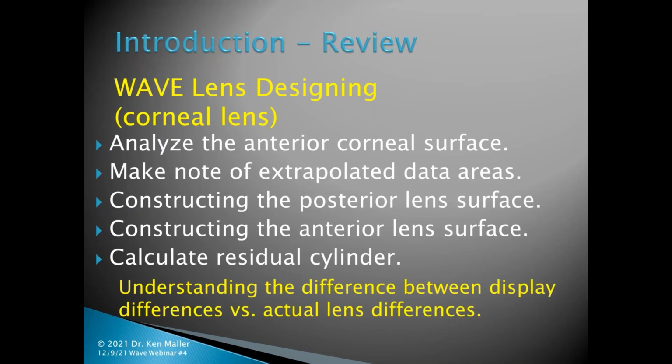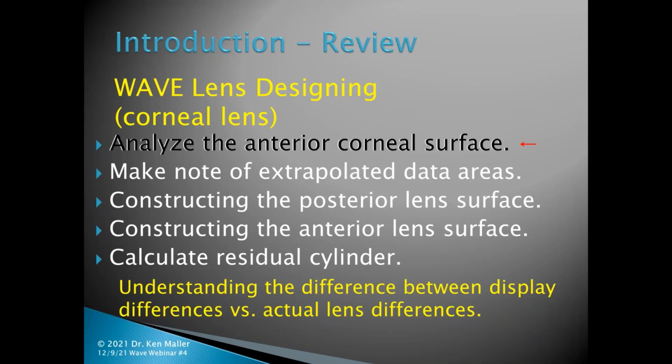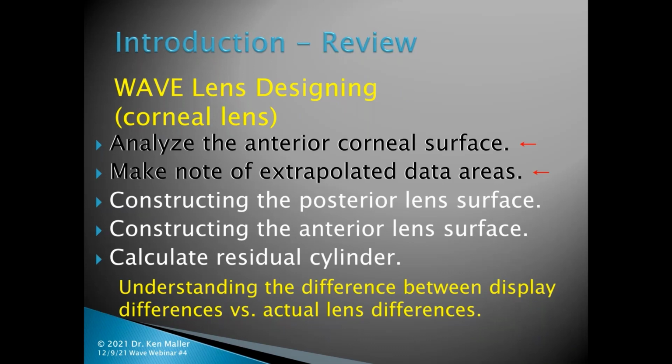We also talked about understanding the difference between display differences and actual lens differences, and that is very important. In the last webinar, we really hit the first topic of analyzing the corneal surface, and we also covered the extrapolation areas and which things we need to pay attention to. So now we're going to get on to constructing the posterior lens surface.